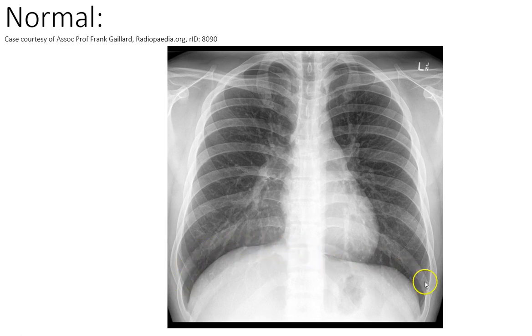The hemidiaphragms, you'll note that the right is slightly higher than the left. Now, some people say that this is because the liver is pushing up underneath the hemidiaphragm. I think if you've got the case of pregnancy or ascites or real large abdominal obesity, a really distended abdomen, it's certainly true that the diaphragm is unable to descend.